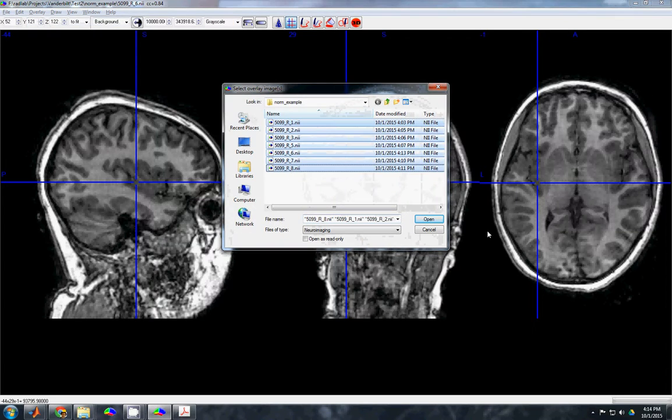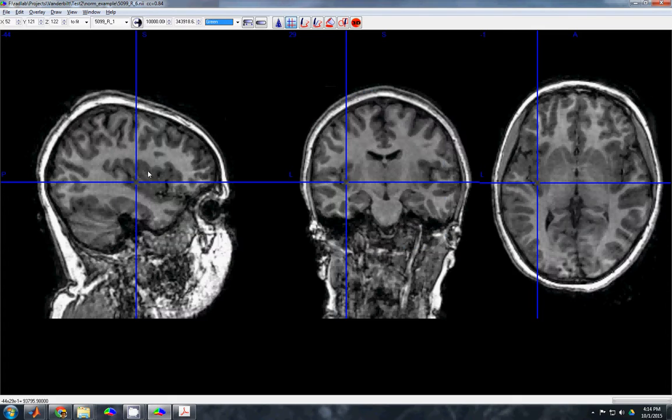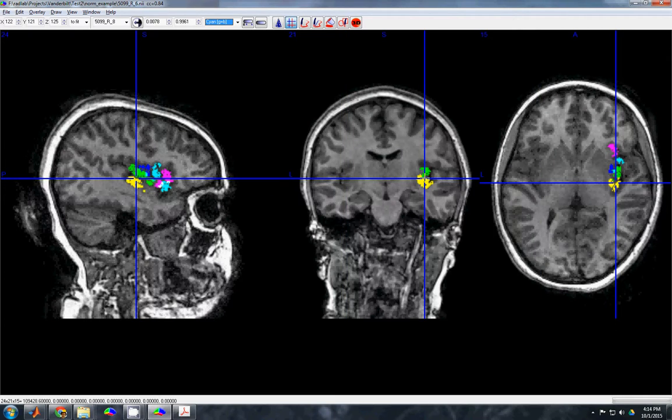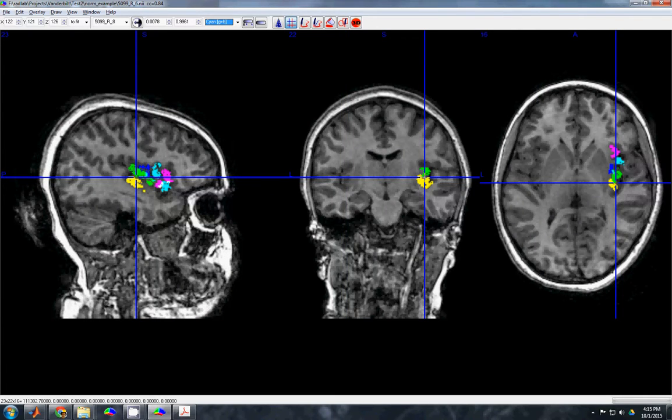Not saying that I'm perfect at this, but if you're just getting these kind of ballpark regions and they look like they're anatomically informed where those boundaries are, we're going to be in pretty good shape, because we're going to find agreement between raters, and that'll really help us map it out. Again, you might have little dots missing here or there depending on your threshold, but make sure you get those overall shapes down. Okay, and then I'll give you feedback on how that goes.